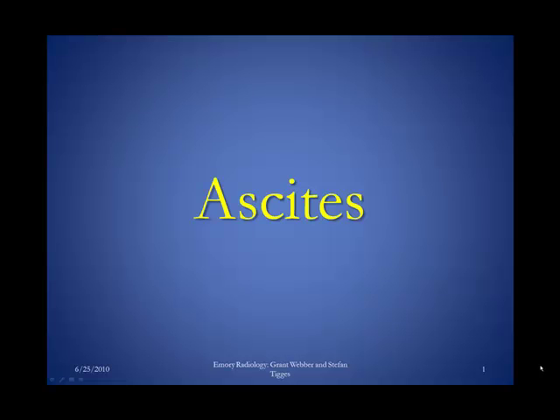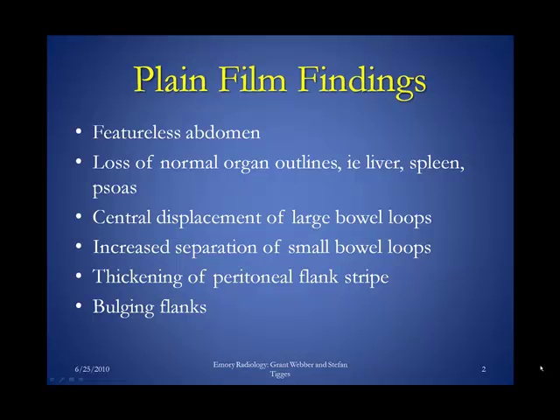Welcome to this podcast on Ascites. We're going to be discussing the radiographic features of ascites with respect to plain film, ultrasound, and CT scan. We'll begin with the plain film findings.